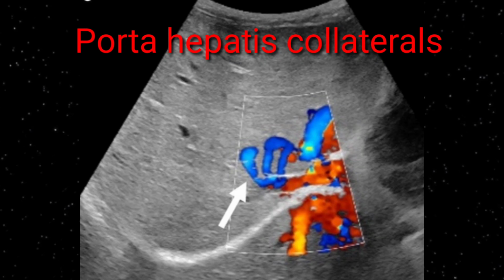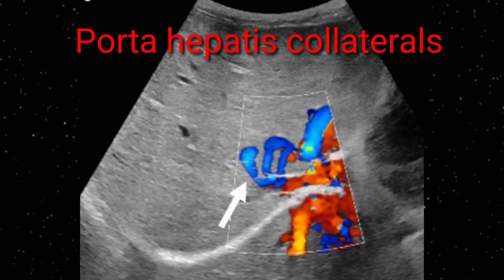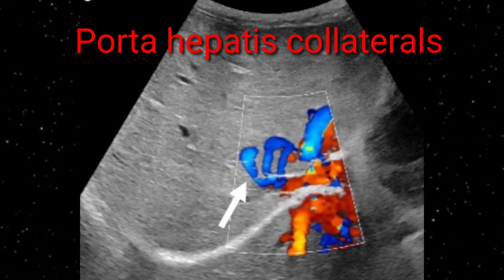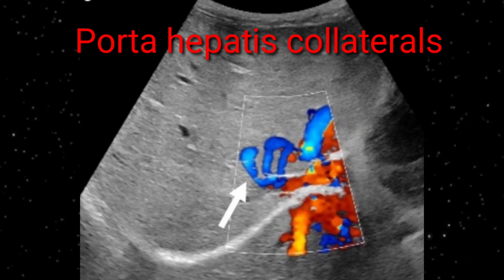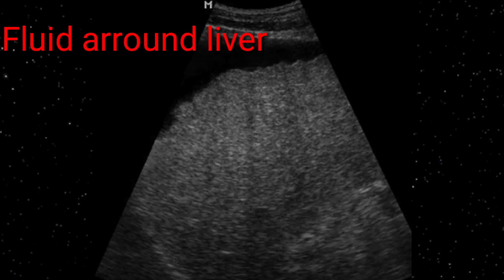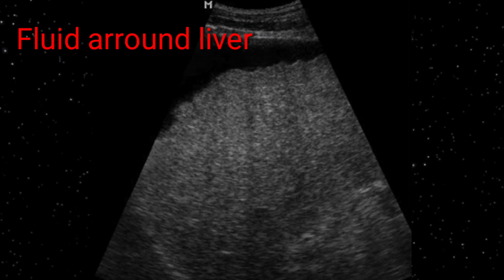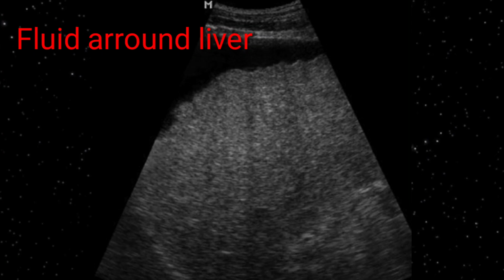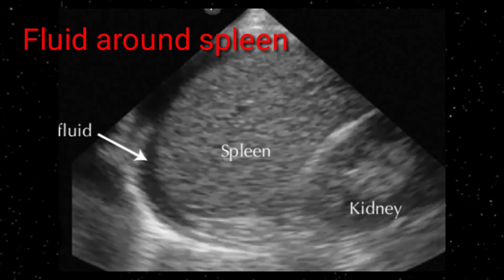In this slide, you can see a porta hepatis collateral. Put the Doppler signals on, and you will see that these cystic lesions are filled with blood, and these are porta hepatis collaterals. In a fully developed cirrhotic patient, you will see ascites. You will be able to appreciate this around the liver, around the spleen, and in the abdominal cavity.